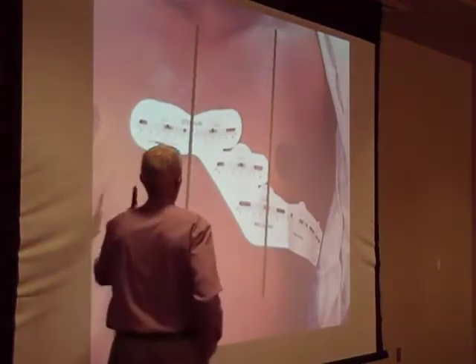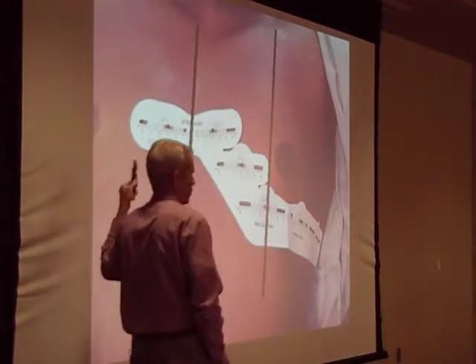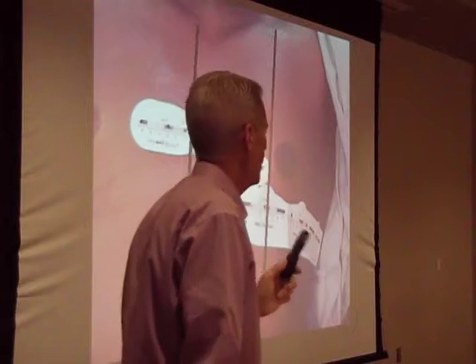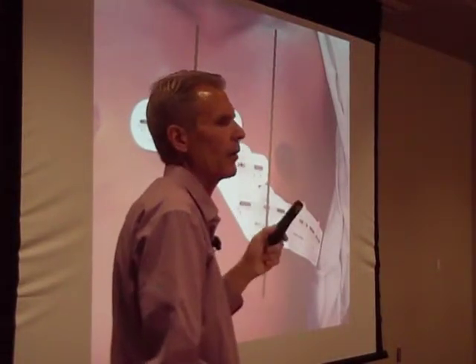Here's that patch I was talking about. We ended up not moving to this because we had more problems than benefits to this. It was my understanding at one time that St. Luke's was using these for a while. I'm not sure that they are anymore.